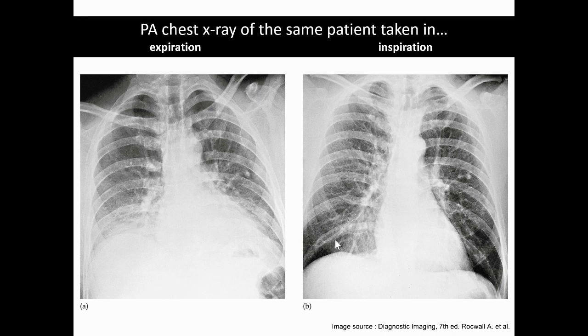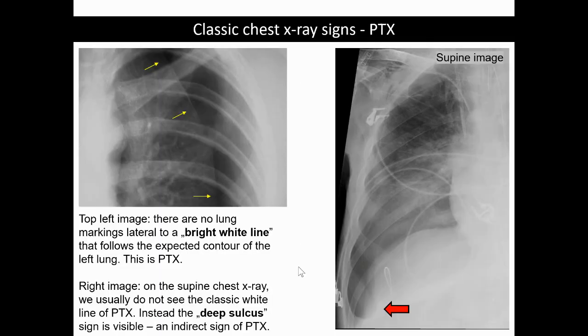But if the patient inhales properly, then you can see that these basal segments remain transparent, and so you will not mistakenly make a wrong diagnosis.